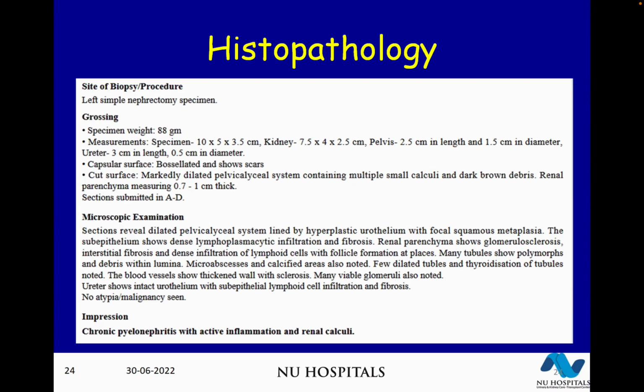Why is there that increased size on a CT scan? Because the vasculature was intact at that time, sir. So that is the important thing. We tend to forget that when the kidney has got its blood supply on a CT scan, it appears to be larger in size. So you don't get carried away just by looking at that image. Look at the entire kidney and see whether this has got something.